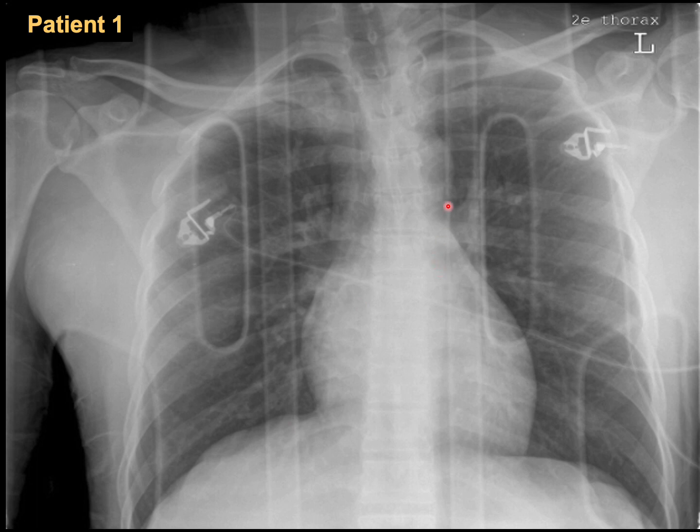Then C, circulation. The heart is 1/3 here, 2/3 here. The mediastinum is okay for me. A, B, C, D, bones, all bones are okay. Scapula, humerus, not very well here. Okay, then E, I think we appreciate the boards, the lines of the electrodes.